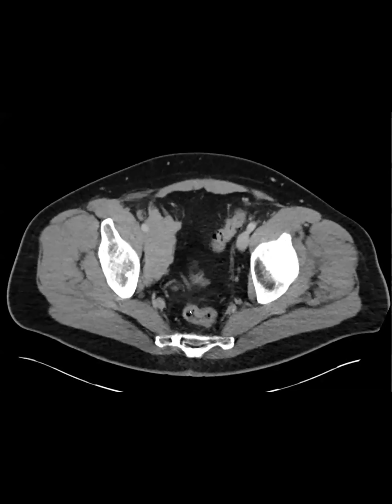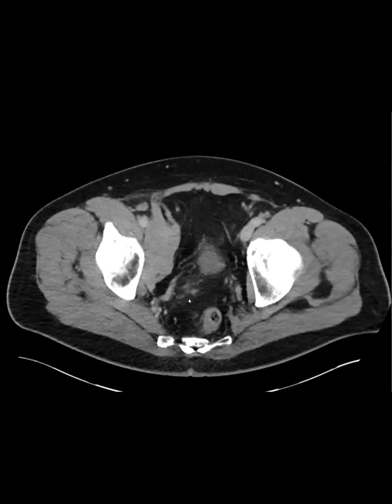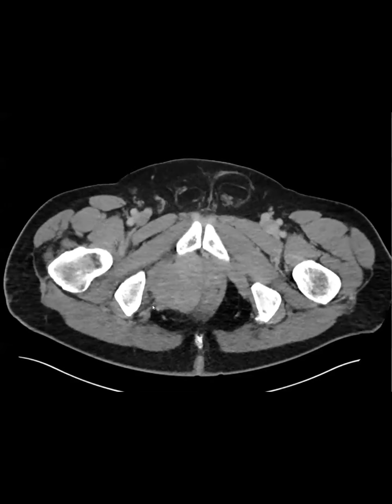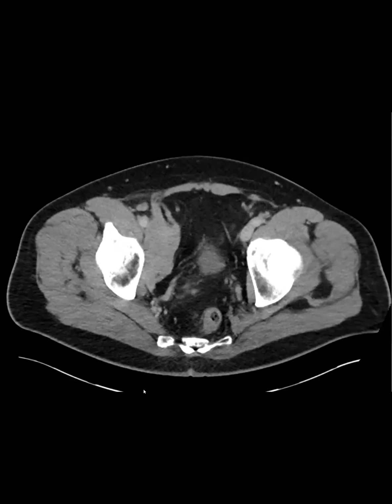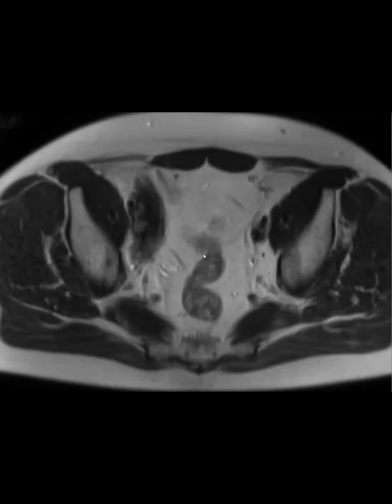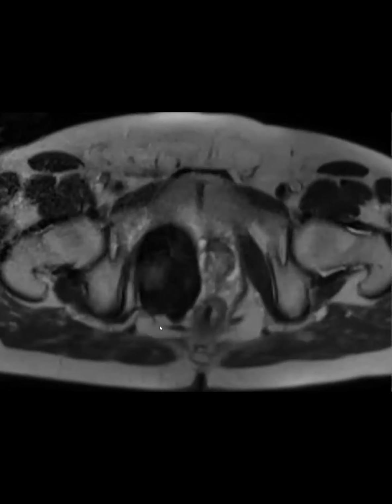I do have an MRI, but any other thoughts? Just based on this, anything else in your differential? Castleman, maybe? Okay, good thought. So that can be unicentric, tends to be more avidly enhancing. Anything else? I'll show you the MR. IgG4. Okay, good thought. I haven't seen it so mass-like as this, but anyway, this is now the MRI.